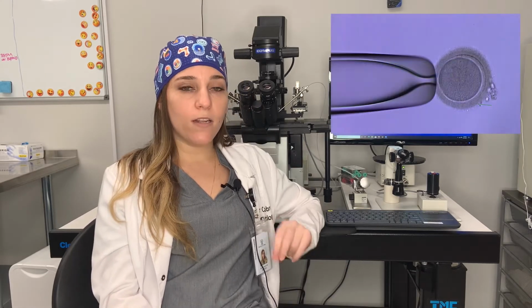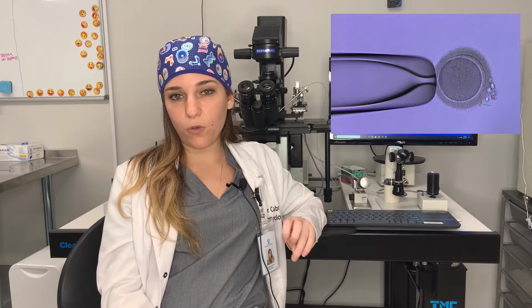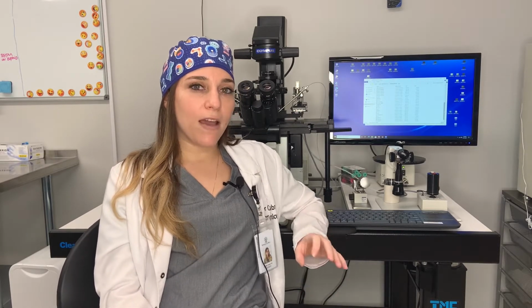When an oocyte is retrieved and stripped and assessed for maturation, there are 3 levels that we put those oocytes into. The lowest level being a GV, which is also known as a germinal vesicle. The second level would be an M1. So M1s and GVs are both immature. M1 is kind of the middle level, and right above that, a mature oocyte is called an M2.